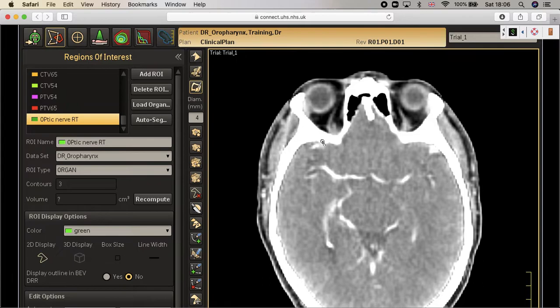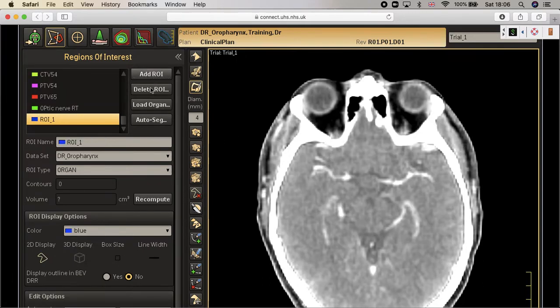And then let's talk about the second important structure, which is the optic chiasm. If you do it in the MRI, I don't have to explain it and I don't have to tell you how to draw it. But the problem is we are facing in our country, and maybe in developing countries too. If someone from a developing country is listening to me now, for those who are drawing it on the MRI and you don't want to draw it on the CT, you just skip these few, maybe 5 or 10 minutes, and go directly to the next step, which will be the hypothalamus.